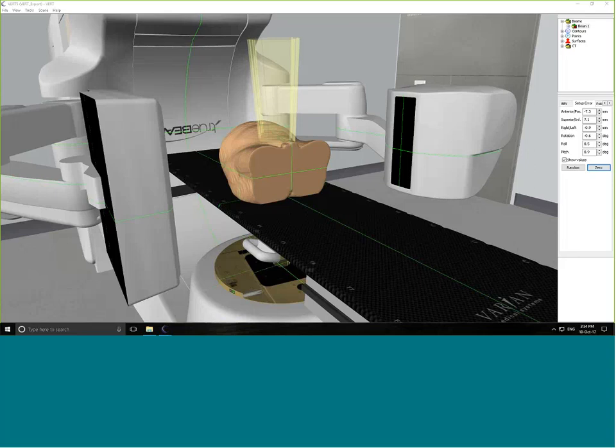Kim, is there a measurement tool to get distances in centimetres? There's not actually, and it's something I've not thought of, and I think it'd be quite useful. Again, I'll make a note of it. If it's something easy to implement for this, then we can certainly look at it. If not, we can make some suggestions for the next release.